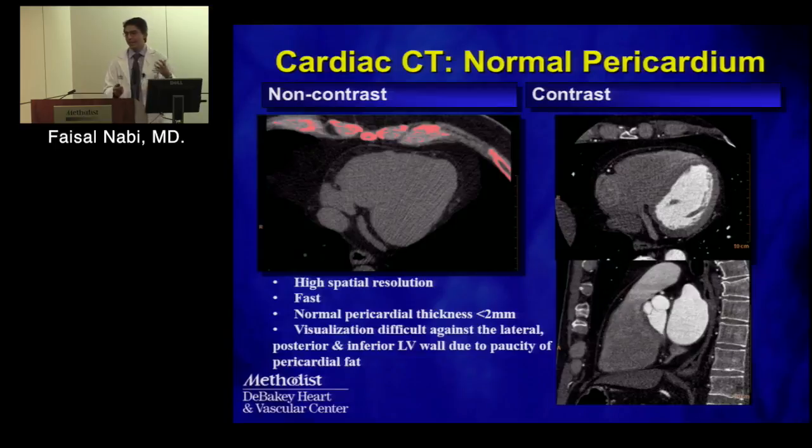We would want to know that you are ordering a scan specifically looking at the pericardium, and the reason is we would make thin cuts of the heart. The pericardium can be very thin, and you don't want any partial voluming. So we would make a series of thin cut CTs, but it can be done without contrast. As you can see, it's this very thin, curvilinear membrane just right outside of the heart, and that's the pericardium.